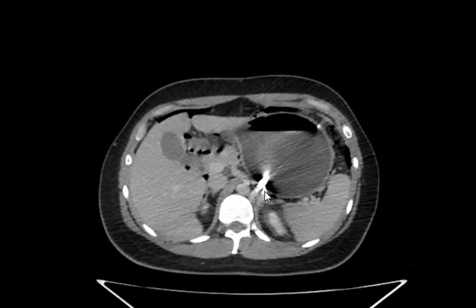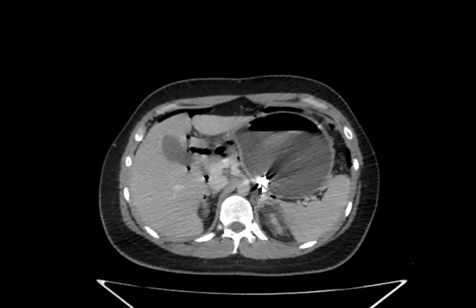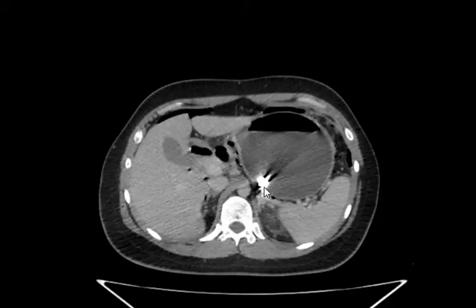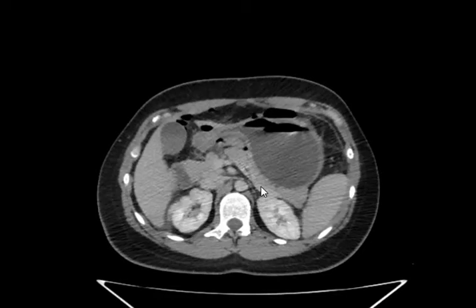And this is post op. Some sort of intervention here. What is this? Maybe she swallowed something, or it's surgery. Yeah. Okay.